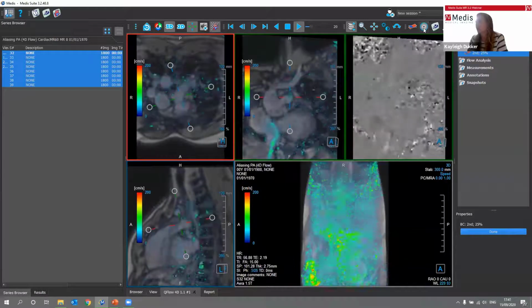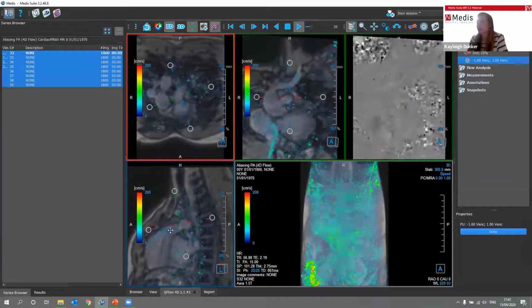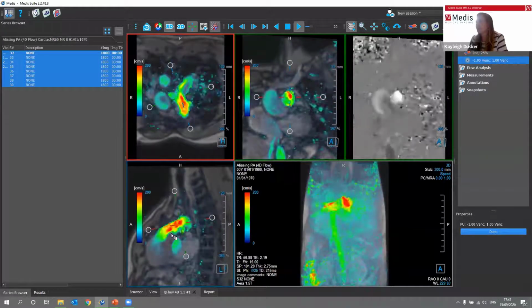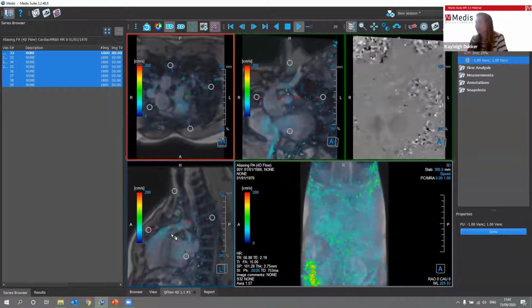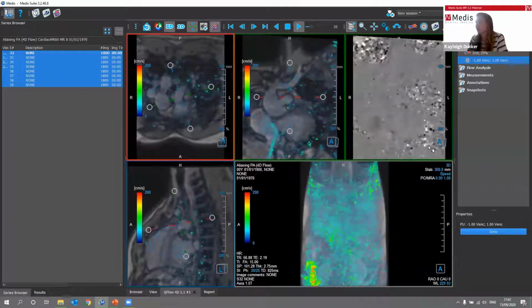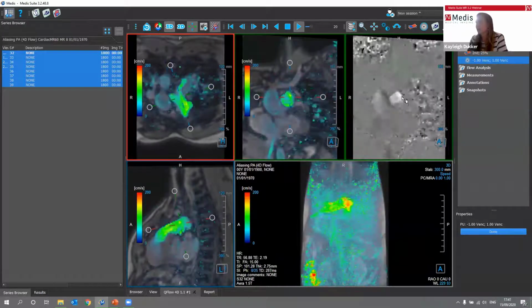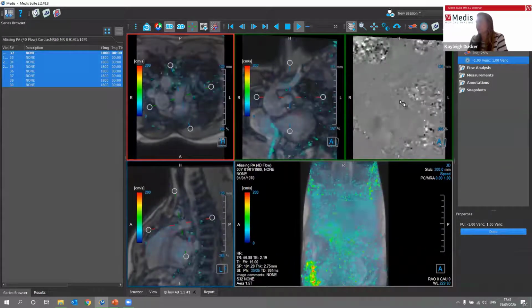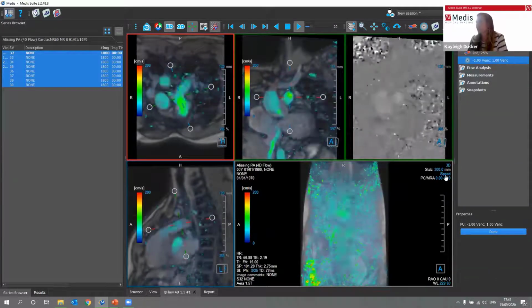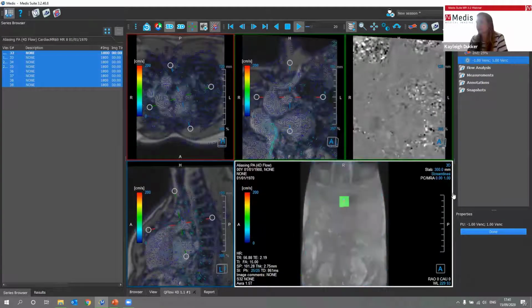And with the button, it will change not only in here, but also the region that you saw on the other part, a bit lower part of the pulmonary artery are now both disappeared. So you see now solid white and no black spots in there anymore. Also in here, let me show you the streamlines in there.